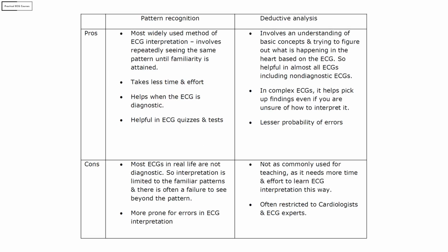This is the concept-based ECG teaching that I have been talking about for years now. This is what I mean by simplifying concepts and practicalizing it for use in the ED. Once you start understanding the concepts behind ECGs and start using them to analyze ECGs, then you are interpreting ECGs at a completely different level.